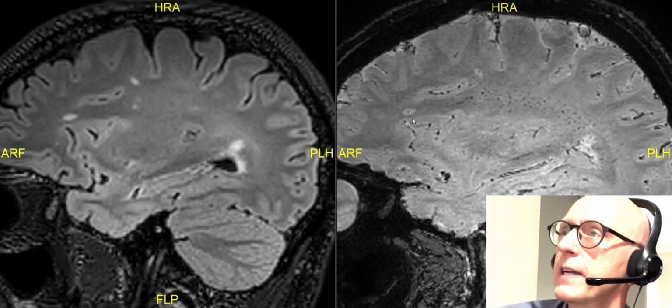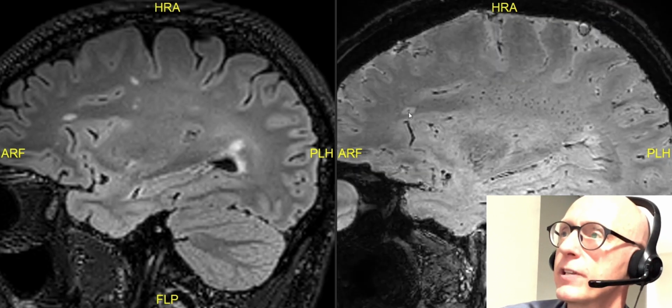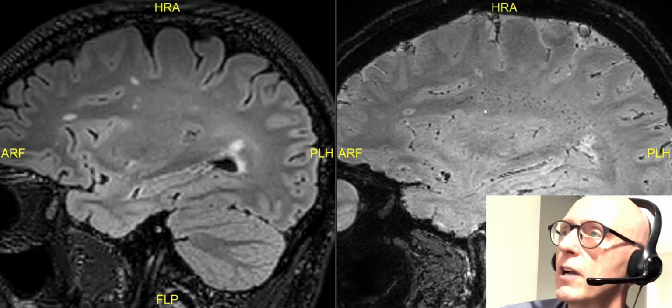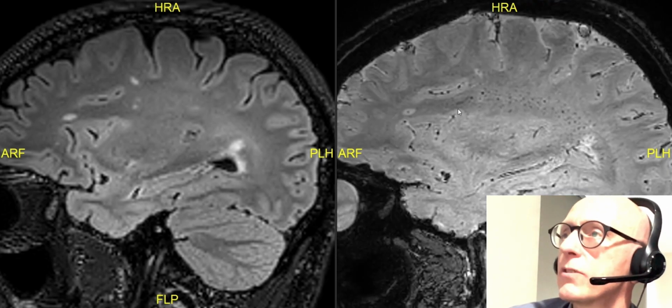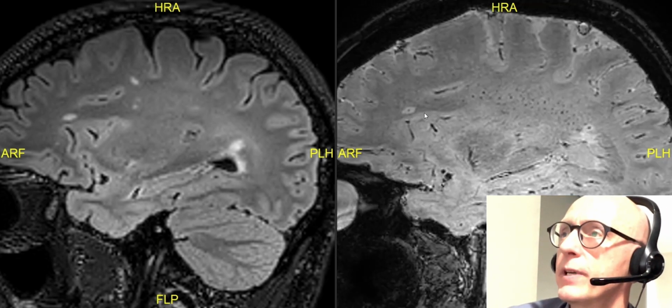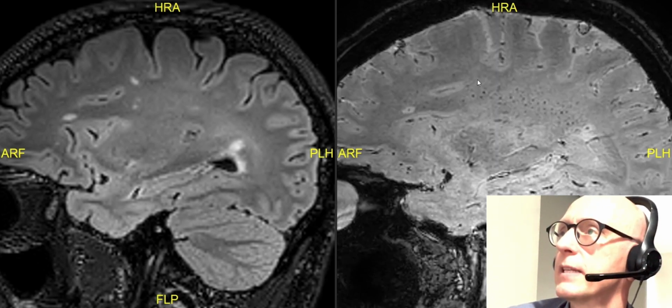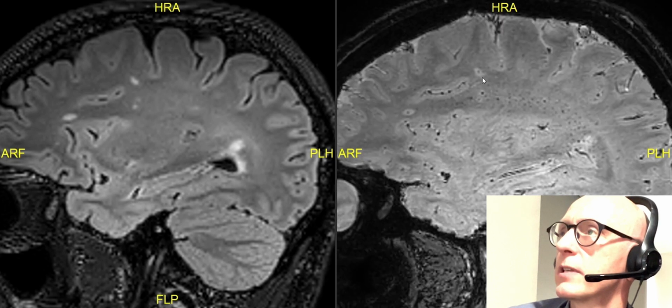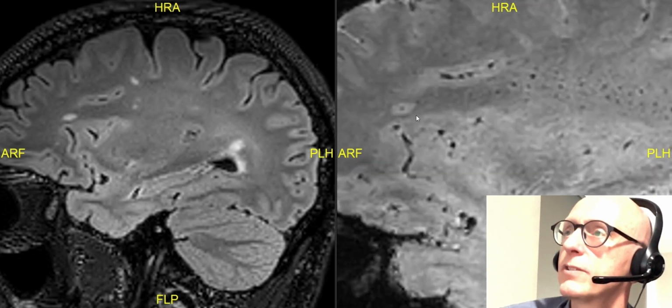When we're looking for the central vein, what we want to see is that we can see the vein enter the lesion and then run centrally through the lesion. A vein that runs along the edge of a lesion or just glances off it isn't considered eligible. It needs to be central within the lesion. And so we've got a couple of nice examples here. Again, I think these are ones that are mentioned briefly earlier, where we can see that the vein is central within the lesion there.